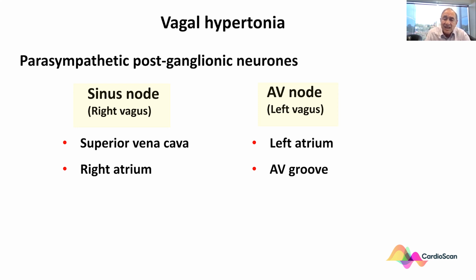But when one looks at the ECGs of young people overnight, you can see why the sinus node, when it is innervated by the right vagus and it is stimulated, causes sinus bradycardia, whereas at the AV node, it causes Wenckebach AV block. And therefore, when both nerves are stimulated, we have a mixture, an amalgam of both of those occurring.